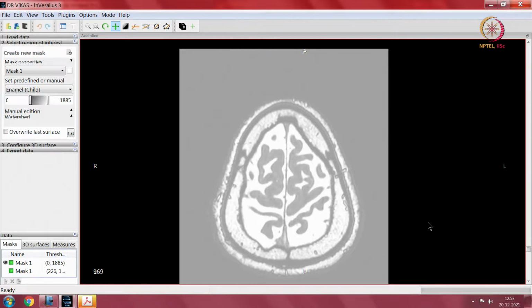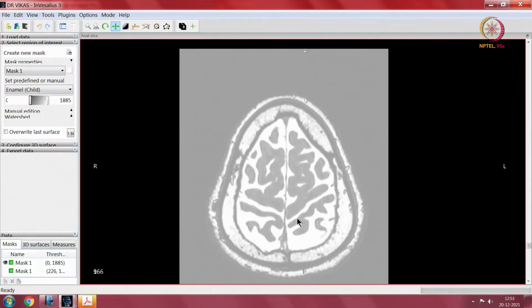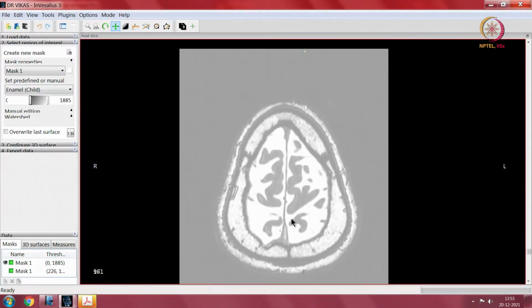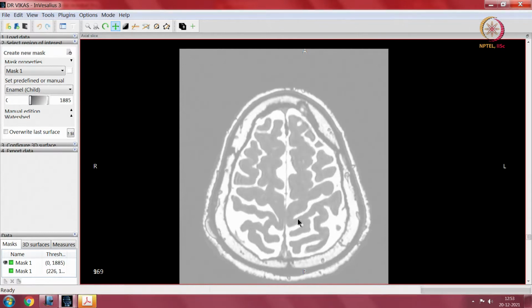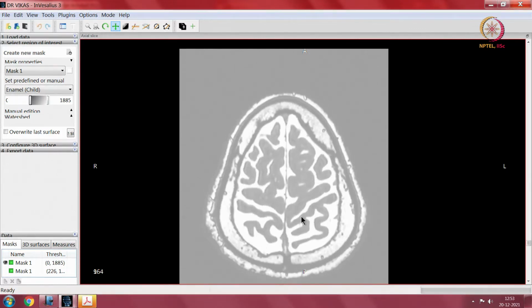You can start, sir. So, that is the central sulcus, thicker motor cortex and the thinner sensory cortex. You have to come up to actually find out where the sulcus starts from. If you go down deeper, you would find that the same sulcus is only on this side and it is not communicating over here. So, that is a key step.